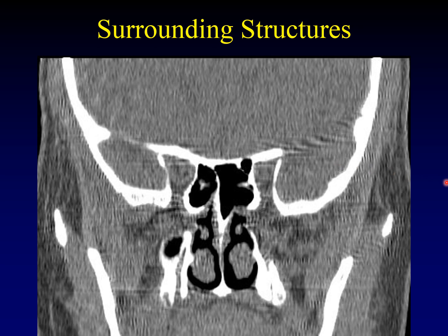So let's go over the word salad from that previous slide. If this is the pterygopalatine fossa, this gap right here that leads from the pterygopalatine fossa into the nasal cavity is the sphenopalatine foramen. And in fact, the sphenopalatine artery and veins are going to run right through there to feed the nasal mucosa.